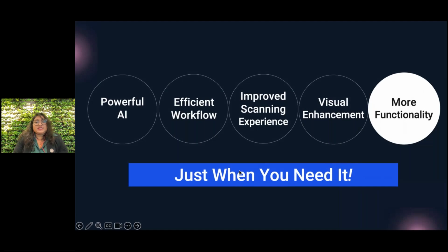Our last key point for the scanning software is more functionality, so you can have certain things popping out just when you need them.